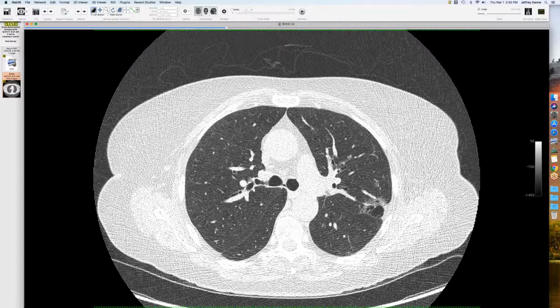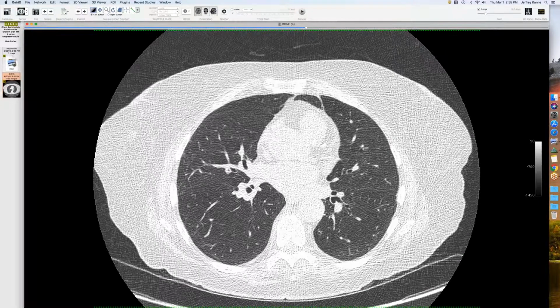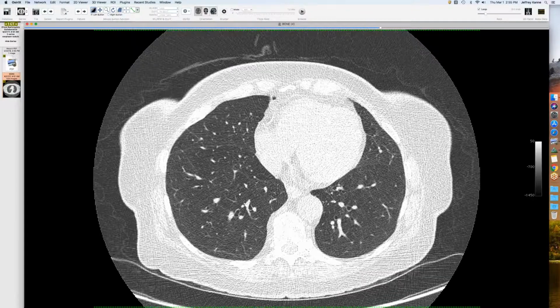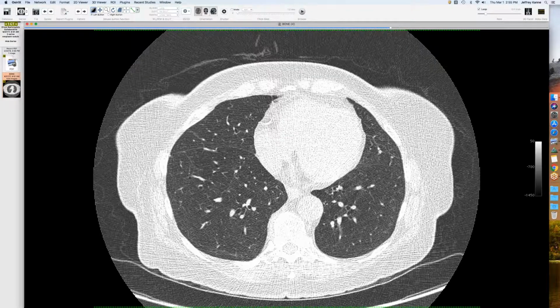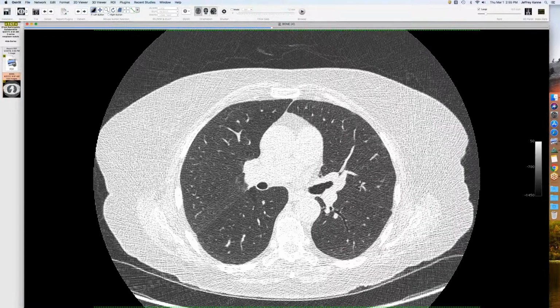If you scroll through the rest of the scan, are there other areas that you worry about for multifocal lesions, ground glass here and not there? Particularly, yeah, and that's something we see a lot. Not particularly in this case. I think the stuff up top was more inflammatory.